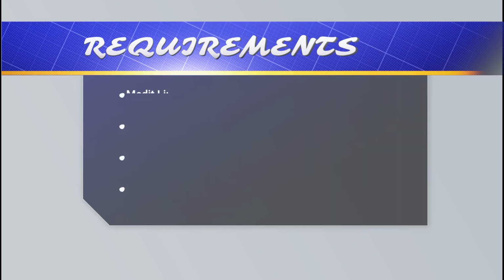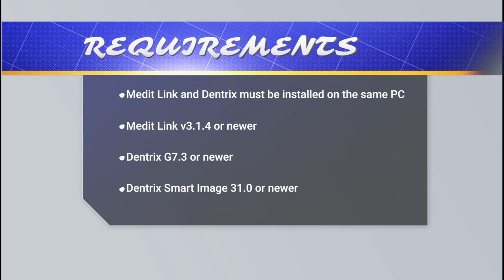with Medit Link. To enable integrated use of Dentrix and Medit Link, both software applications must be installed on the same PC. If you intend to use multiple PCs, both software programs need to be installed on each PC you wish to use. If the software is already installed, please update it to the latest version.